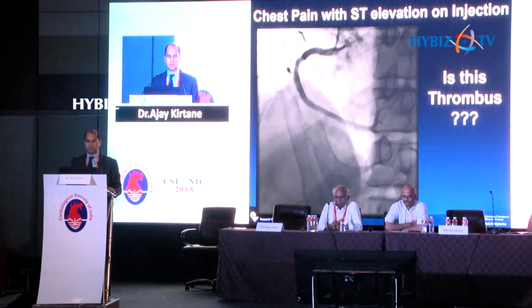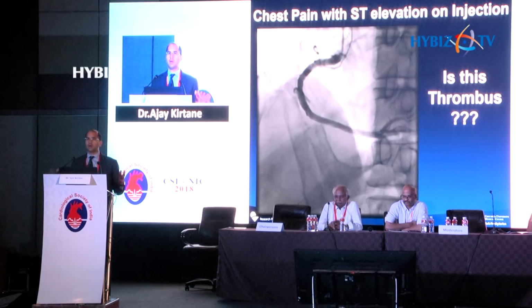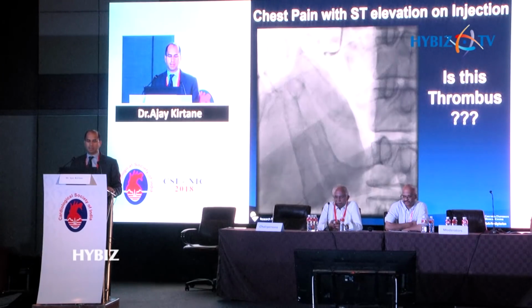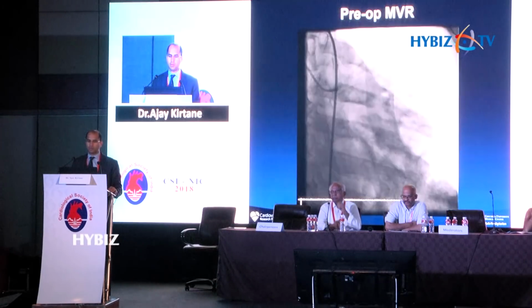What this was just the fact that there wasn't enough adequate filling of the vessel. This is not thrombus. This is a normal artifact seen by incomplete opacification of the vessel and blood mixing with contrast in this area. I reassured the patient, who is doing great 5 years later with no other issues.